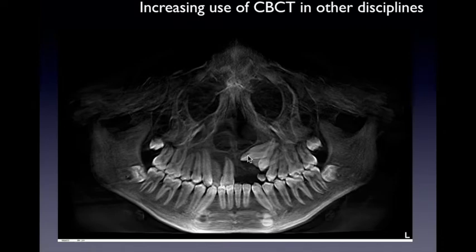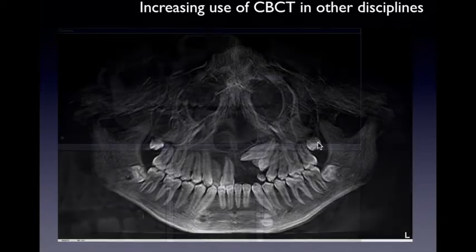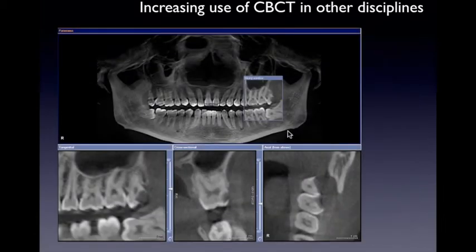Here we cannot determine whether one has a dilaceration or not. Fortunately, in this case, everything was straight. So it's just a matter of knowing which tooth he would move first and which would be done next and so on. Of course, this is an overkill for resto, but imagine we could actually see caries lesions, even very small ones, in this case, determine even how close it is to the pulp.